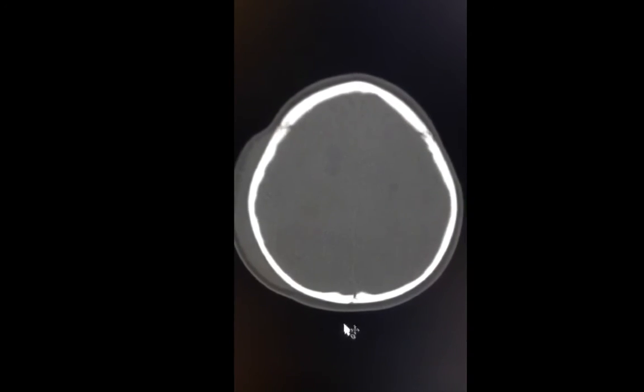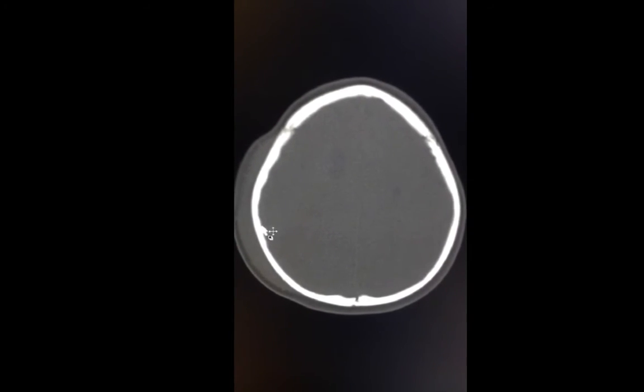This is the CT scan of the same patient. We're looking at the bones now, and we're going to concentrate on the suture lines. Here you have a zigzaggy appearing sagittal suture. This intersects anteriorly with the coronal suture on each side. Posteriorly, you'll see another famous suture, which is called the lambdoid suture. The coronal suture separates the frontal bone here from the parietal bone here.